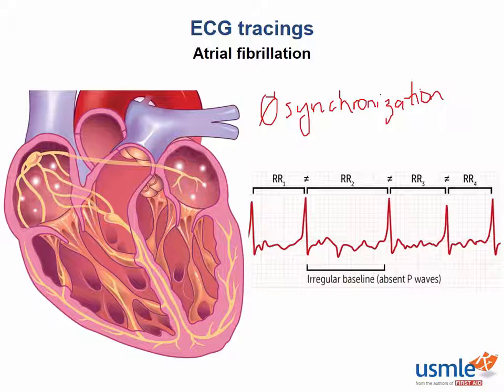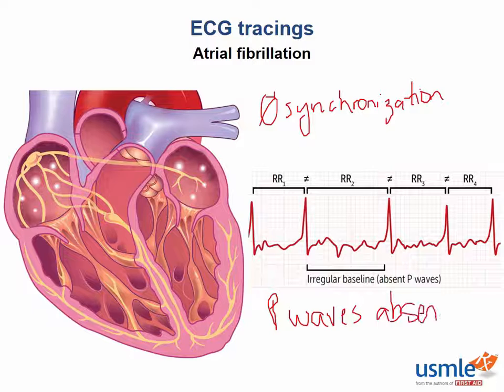No, the P wave represents an atrial depolarization, or the electrical activity of a homogeneously contracting atria. And when all these atriomyocytes are contracting on their own, or depolarizing on their own, there's no P wave that's discernible on the EKG. So in AFib, a key EKG finding is that P waves are absent, or there are no discernible P waves. In addition, we see this irregular baseline of the EKG. This is another key finding in atrial fibrillation on the EKG.